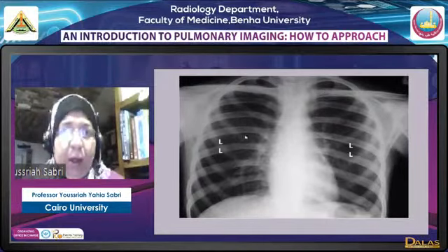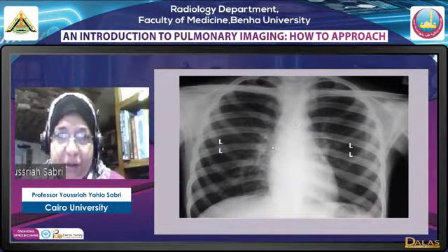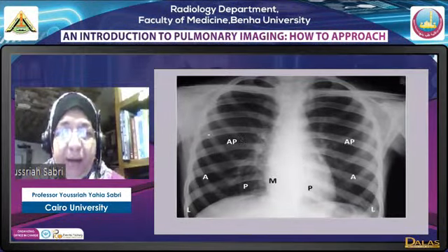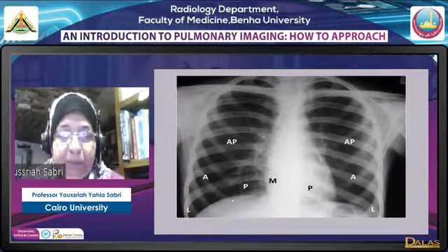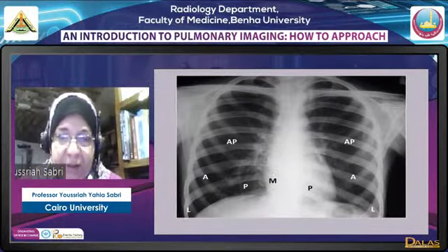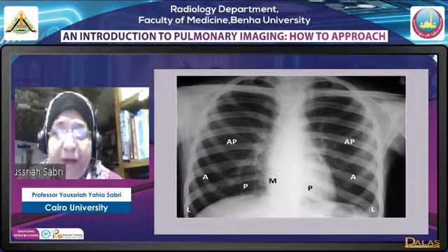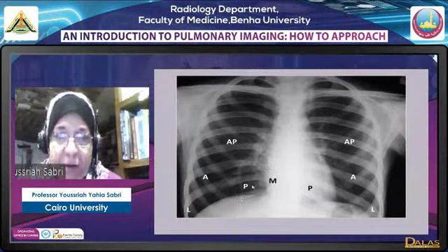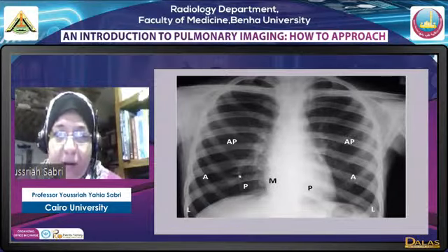بالنسبة للlower lobe. اللور لوب posterior للستراكشر دي، بس في طبعا في الchest X-ray superimposed. عندنا الapical of lower nearly at the level of the hilum on both sides. The lateral basal segment موجودة في الcostophrenic angle. عندنا في الazygoesophageal recess في الmedial basal segment which will be mostly below behind the heart, while on the left side behind the heart we have the posterior basal segment. The posterior basal segment of the right lower lobe is beside the medial basal here, and the rest of the lower lobe is mostly this anterior basal segment.